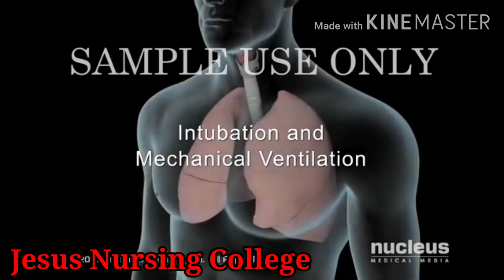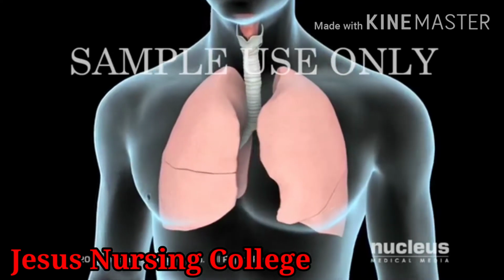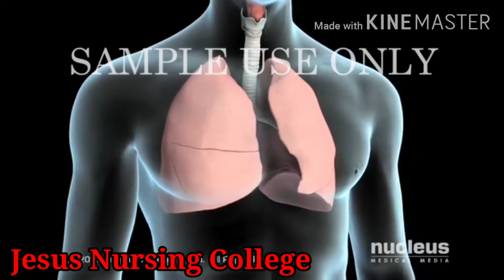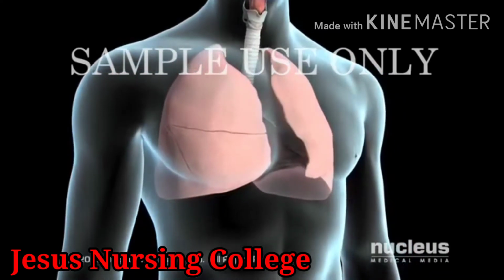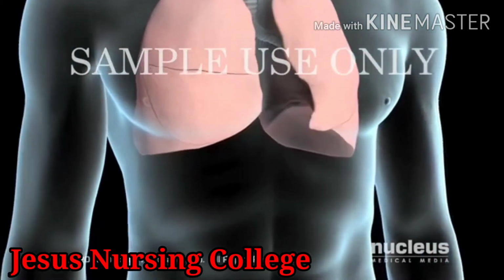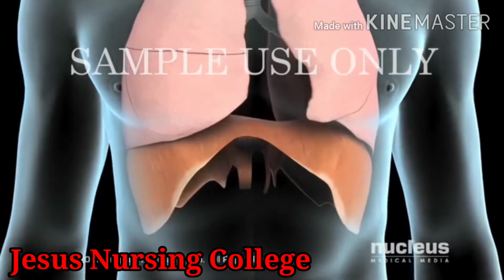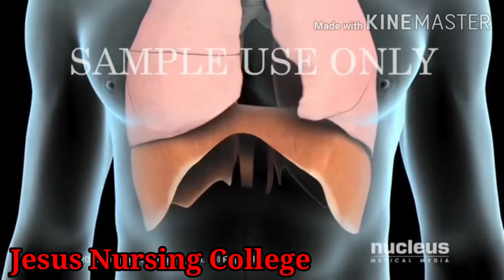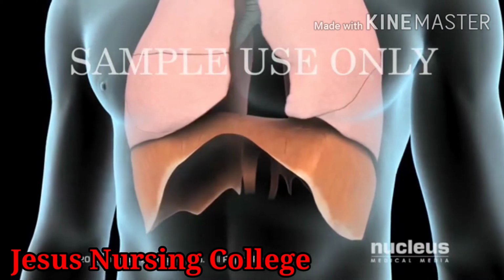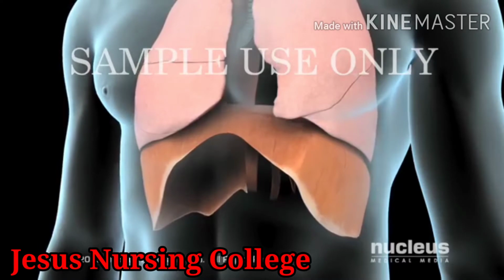Endotracheal intubation and mechanical ventilation are used if you are in an emergency situation involving severe respiratory problems, or if you are having general anesthesia during a surgical procedure. When you breathe, air moves into your lungs when a muscle called the diaphragm, along with other muscles nearby, contracts and causes the chest cavity to expand. Air is exhaled when these muscles relax, and the lung tissue passively returns to its original size.